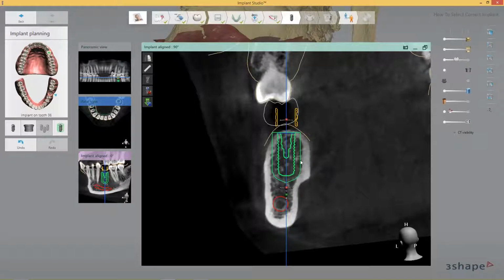What would I like to do with the implant directly after surgery? Do I just want to drop it in and suture and wait for healing? Then almost any implant would actually heal underneath there, even if the bone is not that dense. But if you want to do some immediate loading or impression, or just put on a temporary crown without occlusion, of course, then you need some kind of primary stability as well.